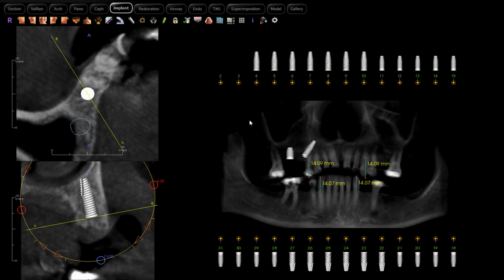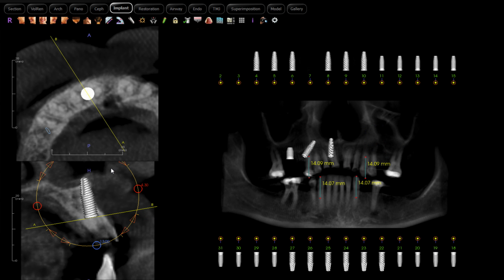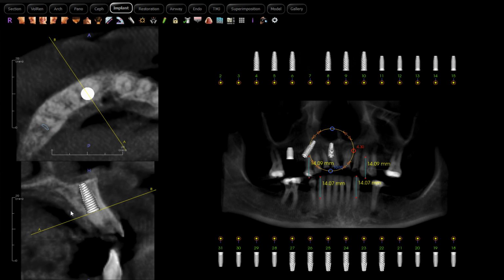Let's center that up. So now let's go to the anterior maxilla, and to be below our planned reduction of the ridge, need to be about this deep. So clearly as I place that 4.3x13, we're going to be up into the nasal floor. So we have a couple of options here. One is to shorten our implant, move down to a 4.3x10, see what we get there.